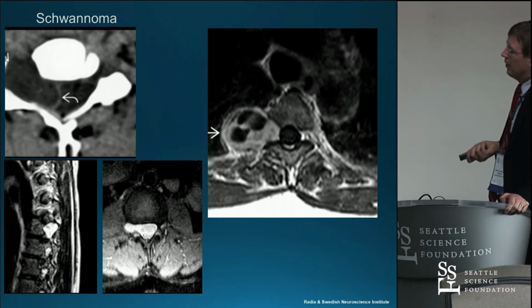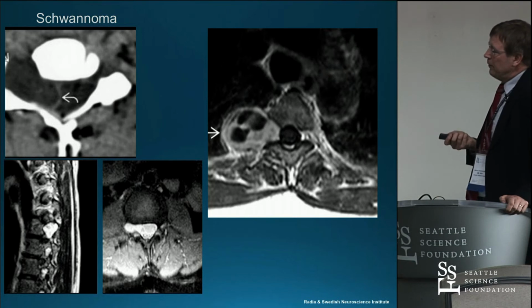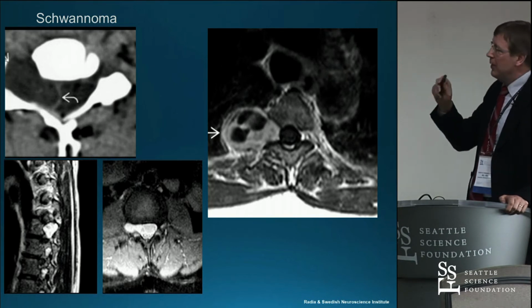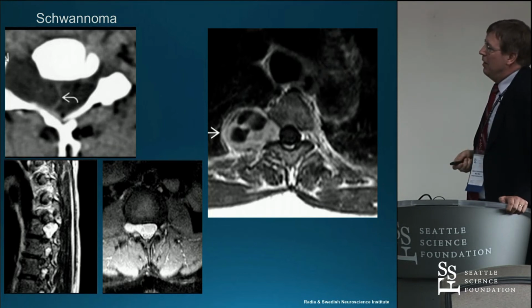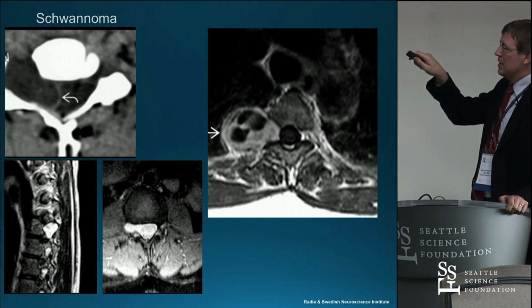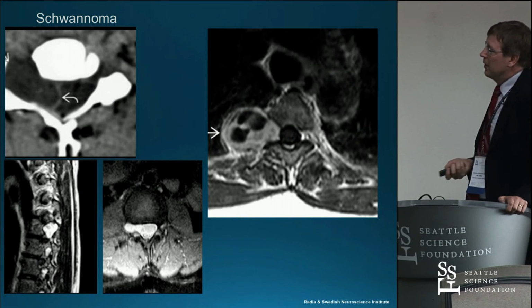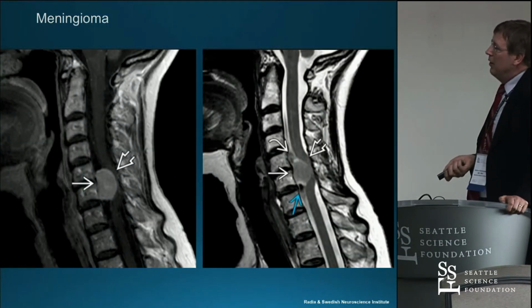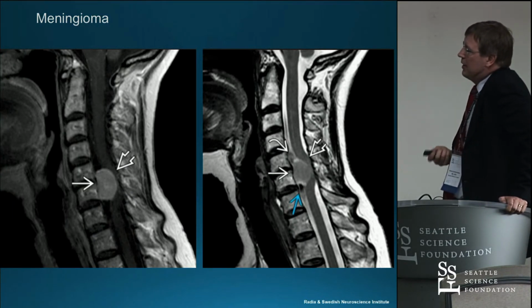So here's a typical schwannoma in the neural foramen. It's expanding the neural foramen. I call this a dumbbell-shaped lesion. This would be basically almost diagnostic for schwannoma because it's involving here extradural and intradural compartments. This dumbbell shape has cystic components, avid enhancement, foraminal enlargement. Very typical schwannoma. Here, meningioma then, we have a dural-based lesion enhancing with a dural tail.